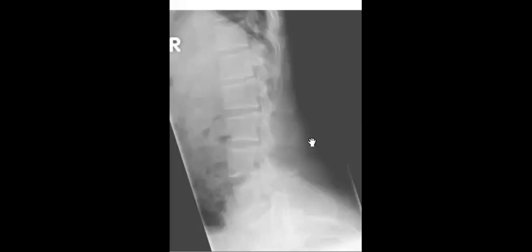Let's go to this case, and we try to make an interpretation. So you will try to find any abnormality in your checklist. So the big title will be posterior scalloping of the lumbar vertebrae. Thank you, Justiana. Posterior vertebral body scalloping.